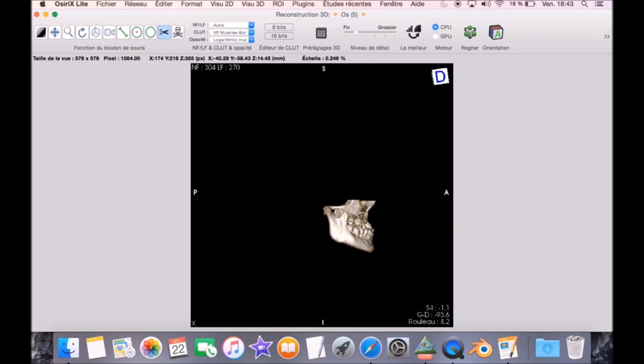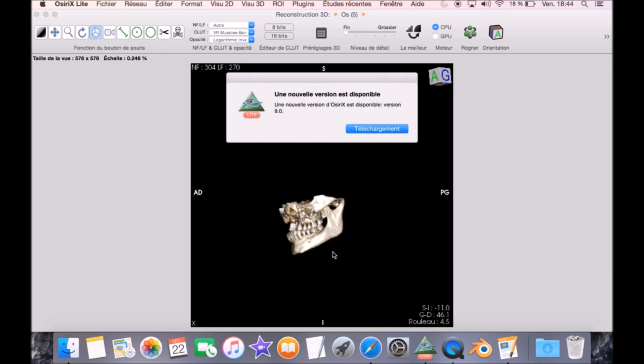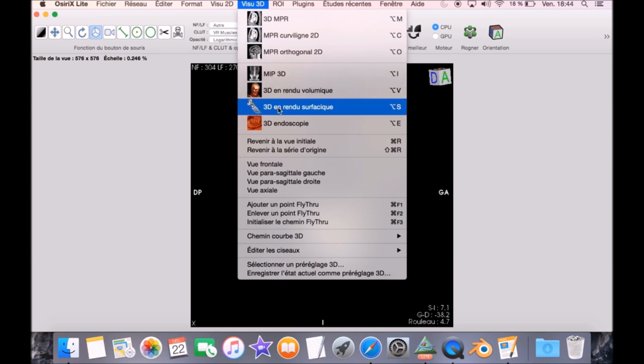It's a very powerful way to crop everything and prepare a small 3D object in a simple way. Now you have two tools in the middle for the detail, which can be really high. Here I just change it, and also here making the surface a little bit smoother, so you hit that, and well, it's not very visible here, but you will have a better example on your computer, but the 3D object is now really beautiful. Again, this window, you just click that fast. Before there was not this pop-up, but now they did that, so it's a little bit painful, but anyway.